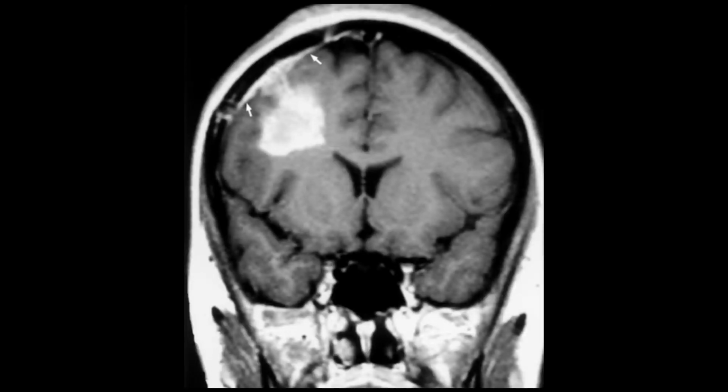oligodendroglioma. So all these cases indicate that the lesions were hypodense. The lesions were not too infiltrative. There was no significant surrounding edema as compared to other lesions, and there was a lot of calcification. In 90% there will be calcification in oligodendroglioma.